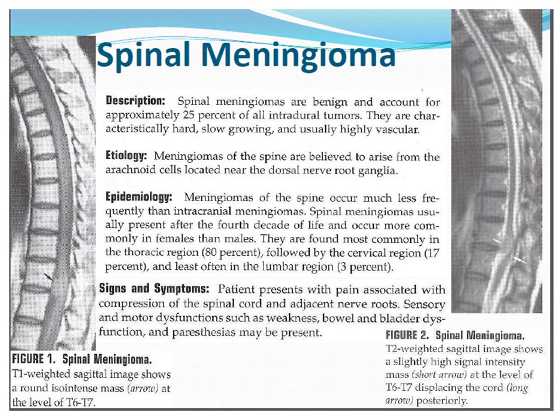Just like with the ependymoma or any rounded thing that you see in the spinal canal, you're going to want to give contrast because that will help the radiologist determine where the lesion is in relation to the cord. Is it inside the cord? Is it in the intradural space, extradural space? The enhancement characteristics also help you narrow down what kind of tumor it is. And these ones usually have to be resected, and the patients will have a good prognosis after that.